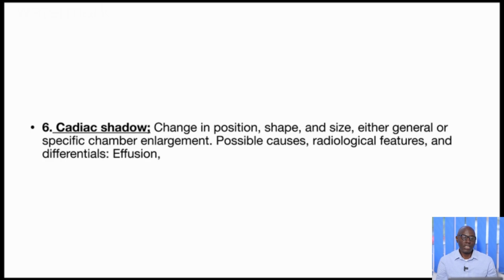But still, the X-ray may be the first line where a hint is given as to what is happening to that cardiac shadow. Features of change in position, shape, and size are very important, and of course it can be specific chamber enlargement and possible causes. So it's very important that you know the shapes of the cardiac shadow.